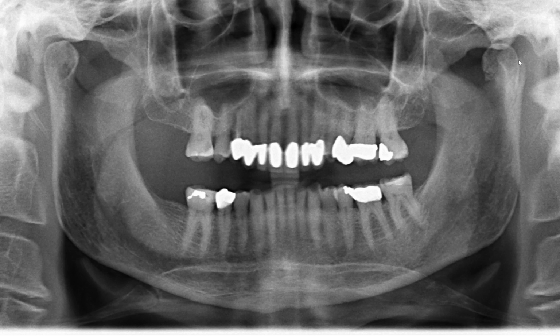Whereas if you look to the patient's left side, this condyle appears to be more anteriorly located than the right side. So if this is the tip of the articular eminence, it appears to be more anteriorly located. And also there's an overlap of the articular eminence and the condyle.